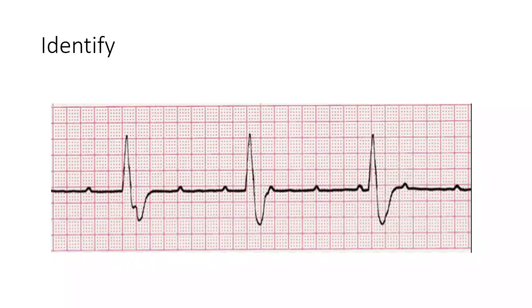Is it second degree type 2? Okay. So she says second degree type 2. It's not second degree type 2. What would you call that? Bella? Call that a third degree block. Yeah. So it's third degree block. Let's look and see why.